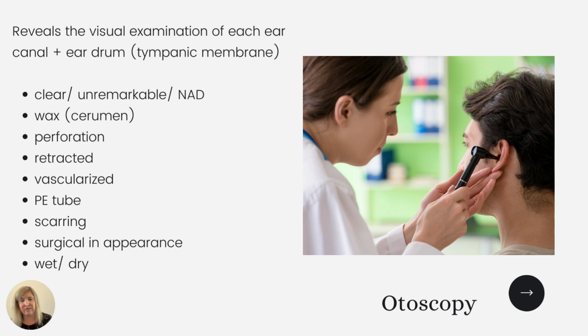Surgical in nature can refer to an abnormal looking eardrum or ear canal. Wet refers to the fact that there's possibly an infection or some draining in the ear canal. And dry could mean that there's psoriasis or eczema or dry skin in the ear canal.